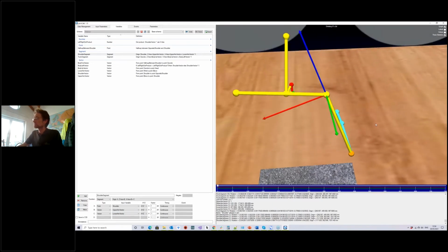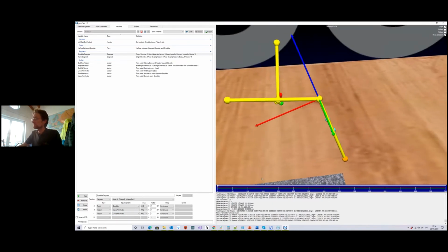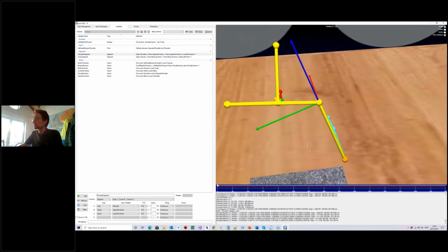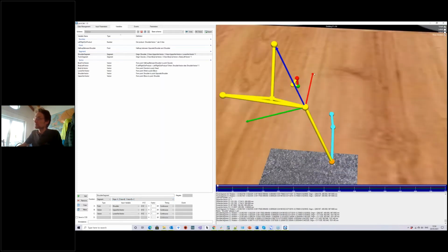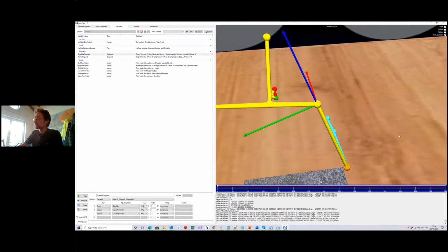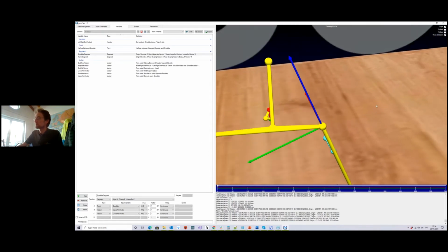In this case, we need to choose a different axis orientation. So we take the z-axis as the basic, and the y-axis is now the cross product of the two, in order to get our x-axis pointing forwards in the anterior-posterior direction, and the y-axis in the medial-lateral direction.